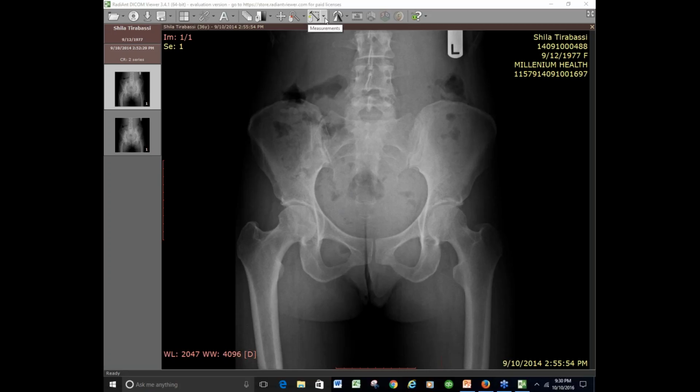Let's go ahead and go to our tools again and use our deviation tool. And again, let's ballpark this. That's pretty close. 0 millimeters, 0 degrees. So that's pretty close to being right on. The lift did its job. Her spine looks a heck of a lot better.